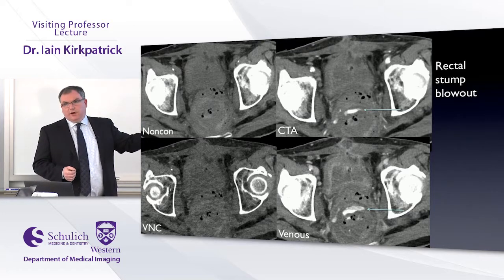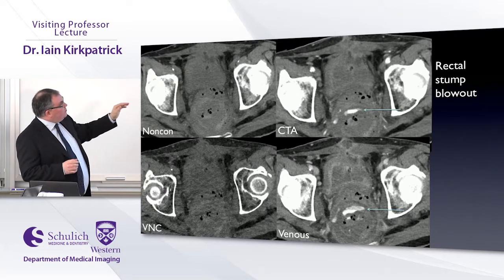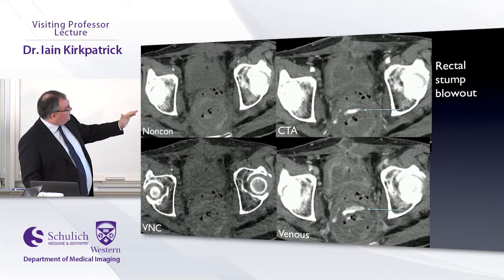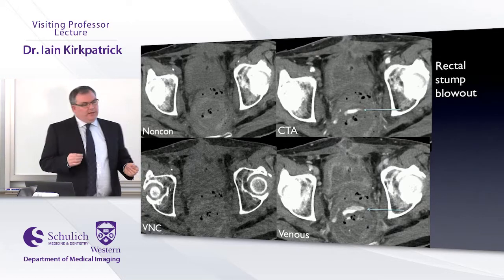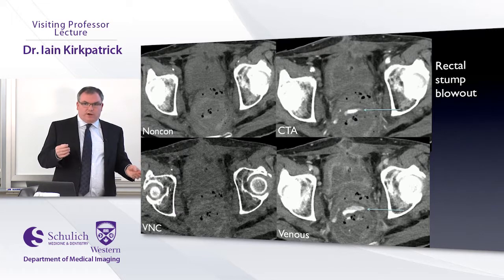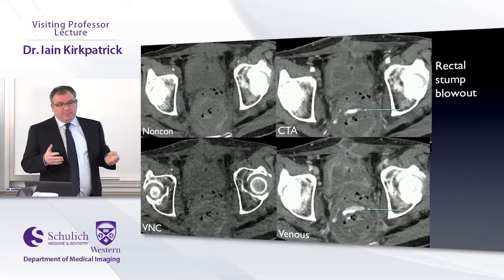So the question is, are these good enough that you don't need to do the non-contrast direct acquisition? And the answer is, well, maybe. They don't look as good as the direct non-contrast images. As you can see here, there's some little artifacts. We're actually doing some research looking at following up stent grafts with dual energy. And one of the things we're looking at is when you do virtual non-contrast reconstructions, how often do you lose little bits of calcification? How often do you lose data when you compare a real non-contrast acquisition to a virtual non-contrast acquisition? And it does happen sometimes.